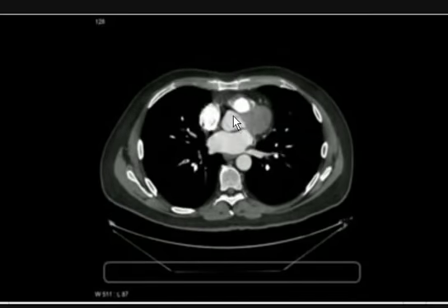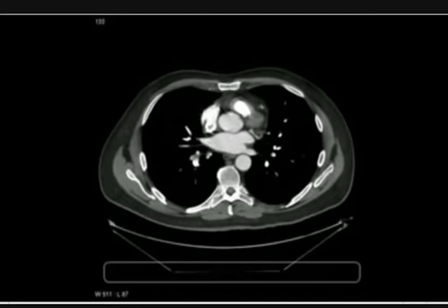Okay, you can clearly see aortic valve here, these lines. Pulmonary vein from left lung draining into left atrium, descending aorta. This will become ascending aorta very soon. Okay, so few more branches draining oxygenated blood into left atrium.